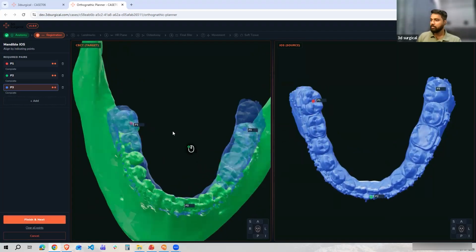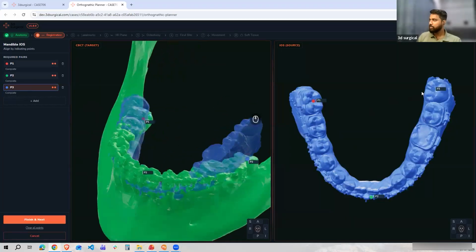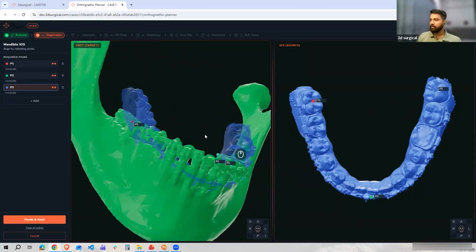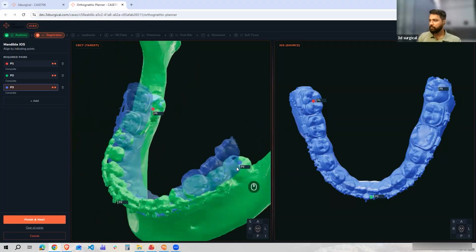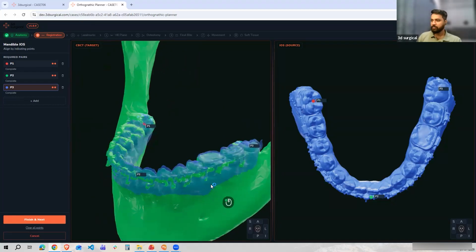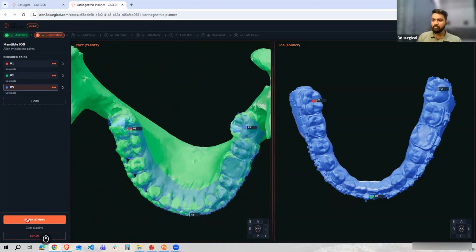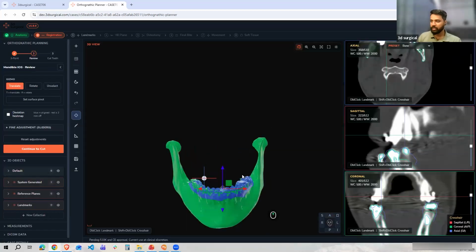Okay, and we can see there is a minor change. So I can just click here. Okay, now I just click here. Okay, and it has mapped. Okay, so I will try to make it as accurate as possible, and then because I have a next step, it's about the review where I can do further modification, right?